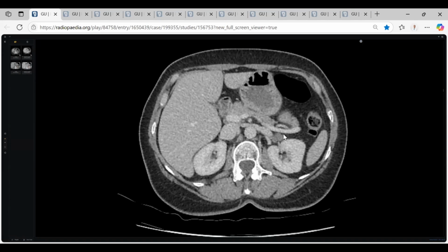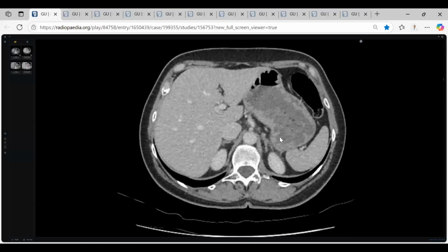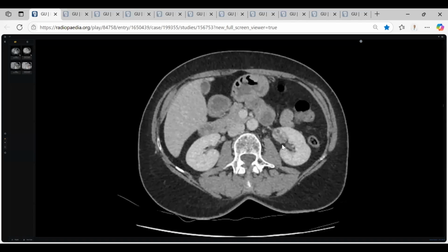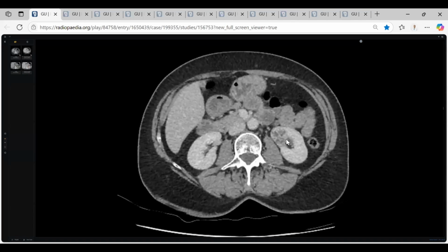So give me another differential diagnosis here. Nerve sheath tumor. Okay, you are right. Thank you, doctor. My colleagues in pathology say this is a schwannoma. Why? Because it is completely abutting the vessels here and is benign looking. Second, this is renal cell carcinoma.